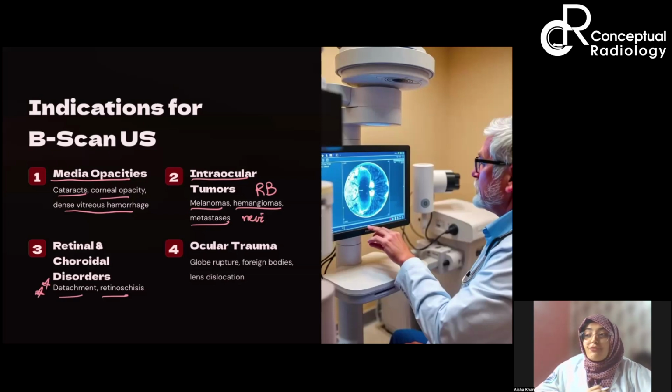And I have seen a few cases, you won't believe, in which all three types of detachments were there, plus the patient was having an IOL also. So there was pseudophakia also, with a lot of reverberation artifact. But still, we tried and tried. We tried focusing multiple times, and then we could detect all three types of detachments.